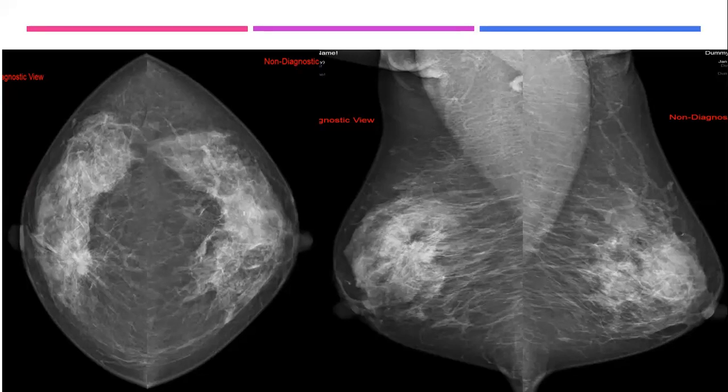So give it BI-RADS 5 for biopsy, and ultrasound for more characterization or for association with other abnormality, or searching for any other abnormality. Yeah, looking for others.